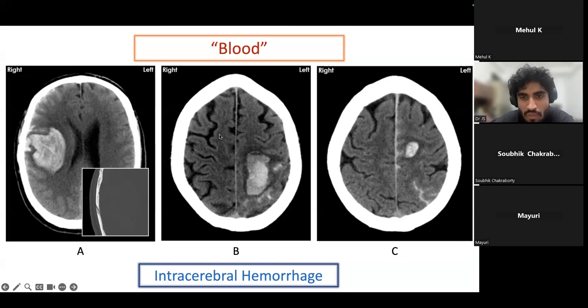If there is a trauma, usually we'll have an intracerebral bleed. We call it hemorrhagic contusions, usually multiple hemorrhagic contusions. When there is a hemorrhage, it is almost like an inflammation, like there is a trauma, because there can be leaky capillaries, so there can be ooze as well. So there can be edema and other features that can be appreciated around it.